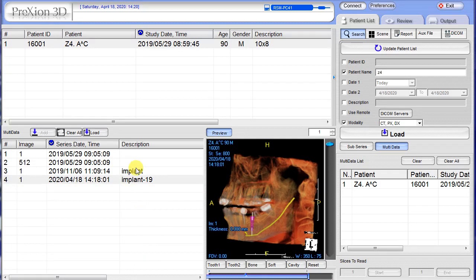You can save a scene from a scene that you launched. However, it will not save over the originals you see here. It's created a second one. So you can continue to save scenes if you wish, or if you want, you can delete previous scenes or ones that maybe you don't want to keep.